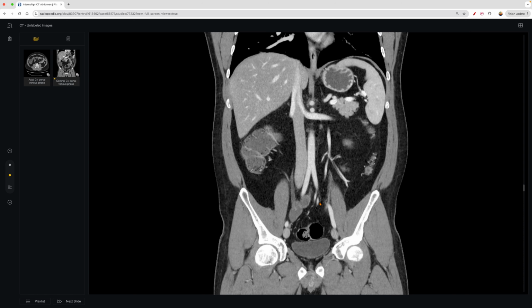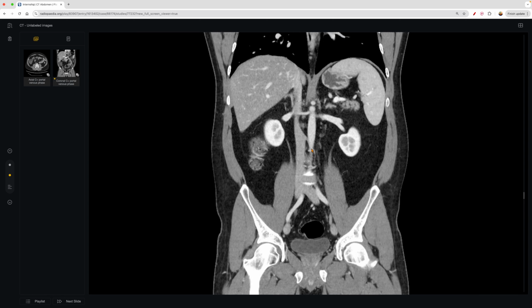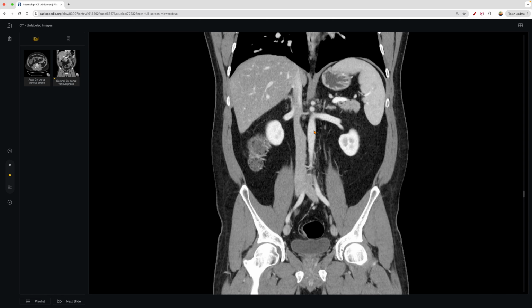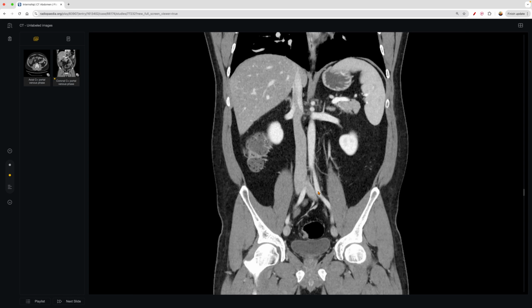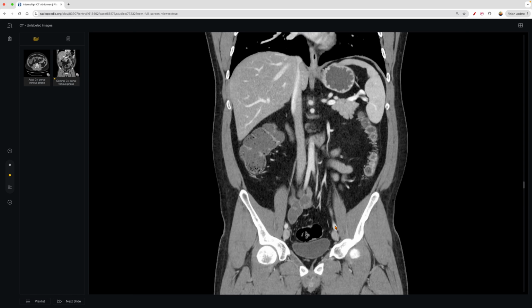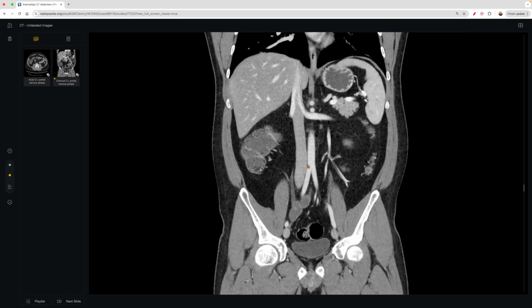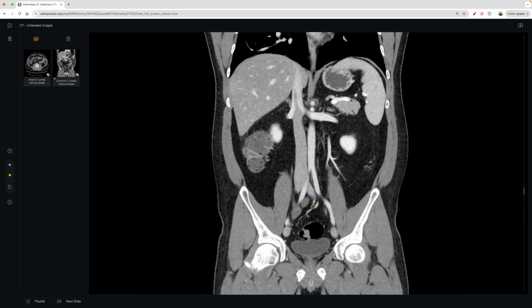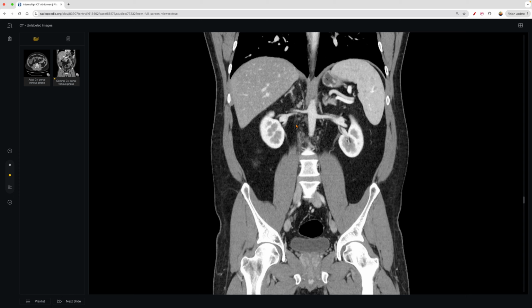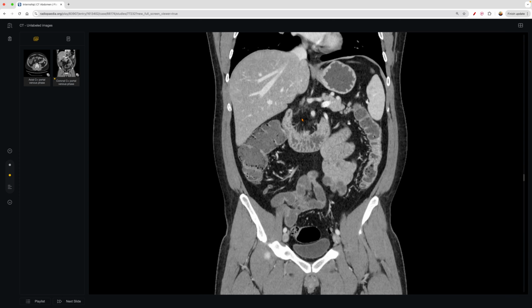And then otherwise, while we're here, you can appreciate the left-sided structure here is the aorta, abdominal aorta, and it comes into the common iliac arteries. And you can trace all those down, and perhaps you can appreciate the divisions of internal, external. But otherwise, you can see the inferior vena cava as well, and it'll give you the same idea. And this patient, it's very easy to appreciate. Sometimes it is a bit more difficult.